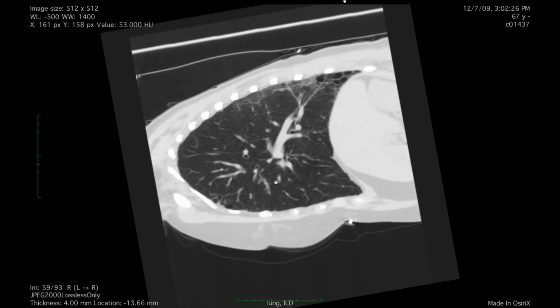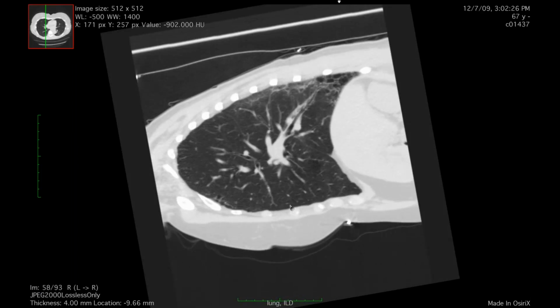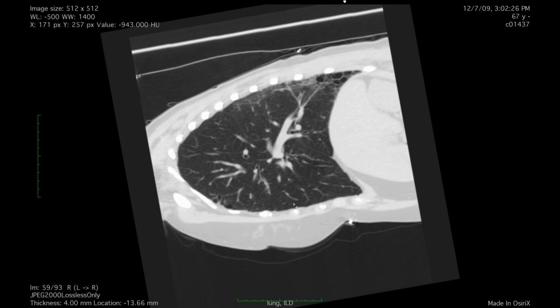Yeah. So, I don't buy this particular distribution here for aspiration. Most adults don't sleep prone because it hurts their back. She's 67 years old, and it's so localized way out against the periphery like this. Usually aspiration gets the central airways on the way to the periphery, and they don't seem to be very involved in her.